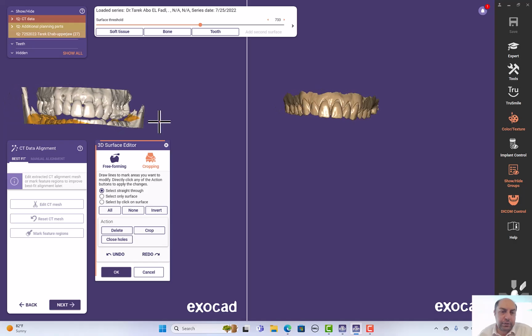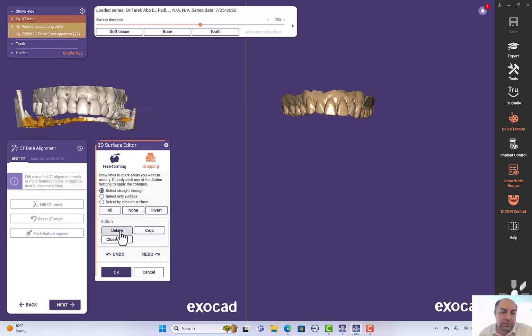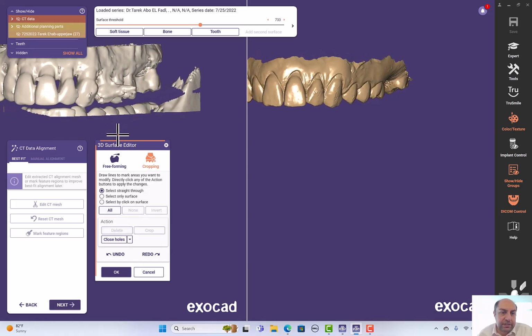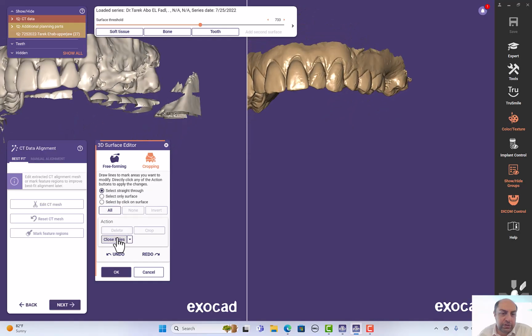I'll show you. For example, here, I will delete this one. Let me guess. There is an intersection here, so I will just remove it. This intersection. Okay. It's a small one. And I will delete it. But I had a hole here in my tooth. I can close holes.